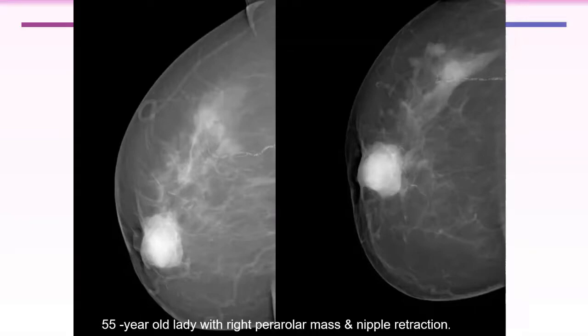Is it normal or are there no other nodularity within this parenchyma? Yes, it is dense and nodular, but there are other multiple equal density small masses extending into a segment in the upper outer, extending down to the nipple. So I have a single retroareolar lesion and other multiple lesions. What is your differential diagnosis? No distortion or calcification or diffuse skin thickening. So what could it be?